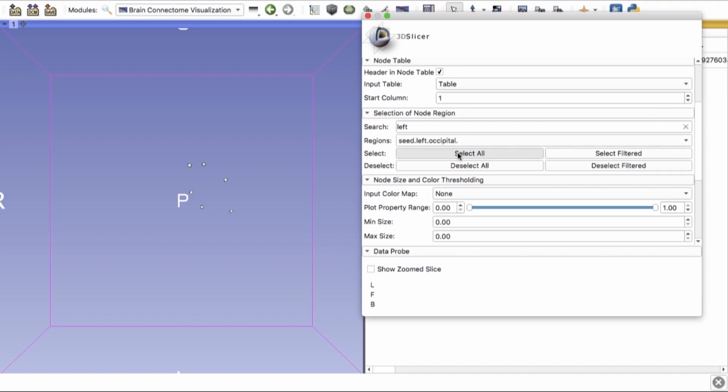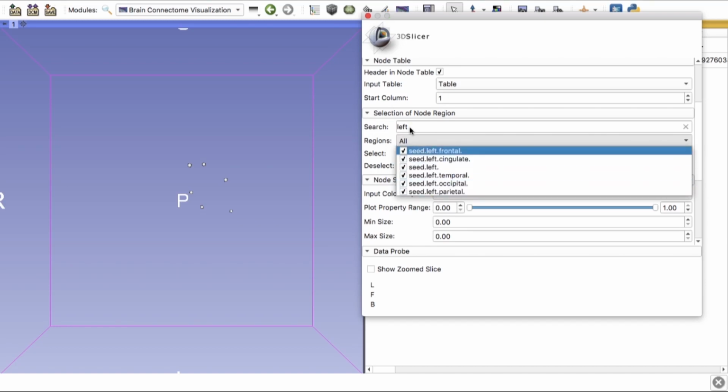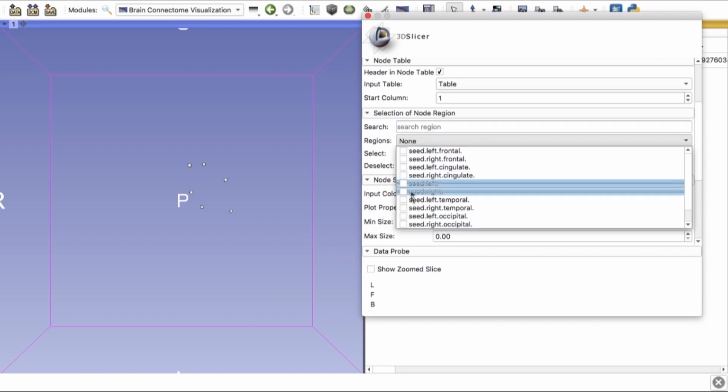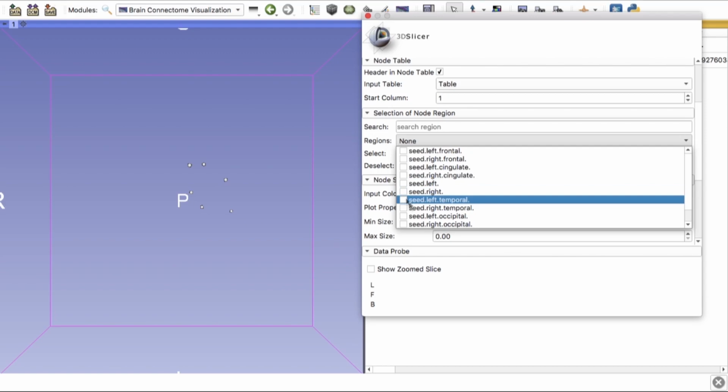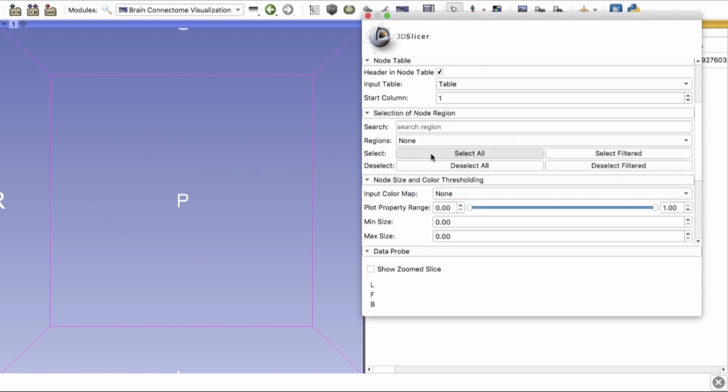And then, again, you can select all, and then we'll select everything here in the filtered things. But then you have to reselect again here. Okay, very good. So select all. Takes a bit of time.